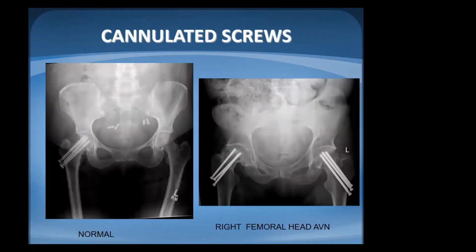I'm going to show you examples of other types of prostheses and a few of their complications. These are cannulated screws. They normally place cannulated screws when we diagnose an early Garden 1 or non-displaced fracture of the neck of the femur, and we want to save the femoral head. So this is a good procedure because it's done percutaneously. They don't open the focus of fracture. You place these 3 cannulated screws and all is hunky-dory and the femoral head is preserved, in a large number of cases.